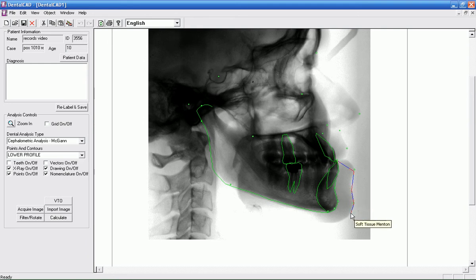That is very important because in the dental VTO, your lip will rotate around that point as your incisor goes forward or back in your predictions. The same thing on the upper. I just pressed F2. I start with glabella, down the tip of the nose, subnasal.